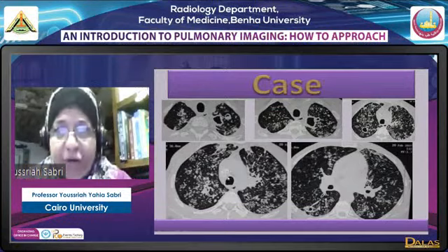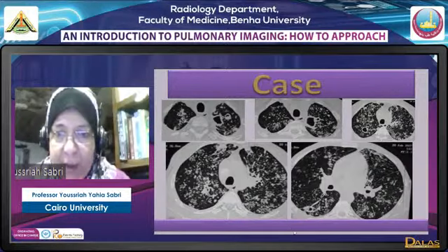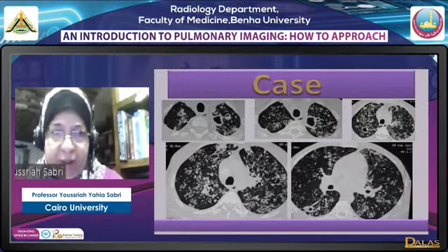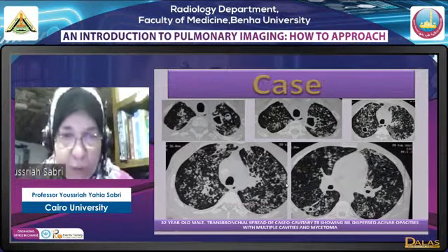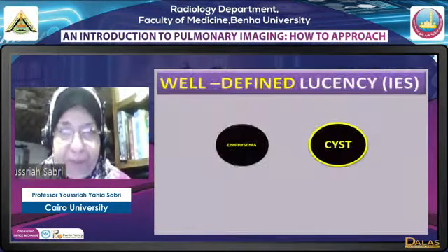Here they are associated with cavitary lesion in the apex, with cavitation with mycetoma, cavities and cavities with mycetoma. And this is actually a case of tuberculosis with transbronchial spread and what we call pneumonia, tuberculous bronchopneumonia. These are acinar opacities, acinar nodules.